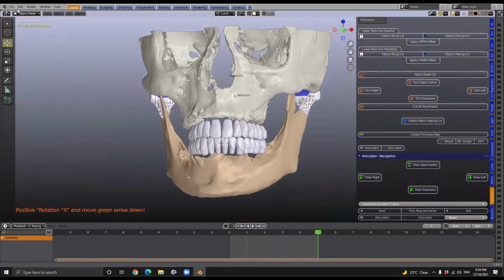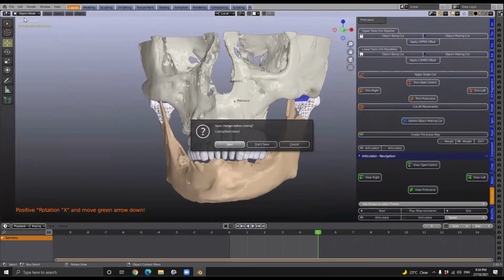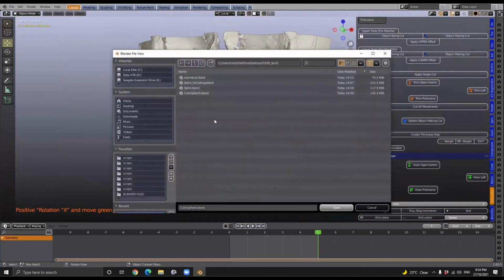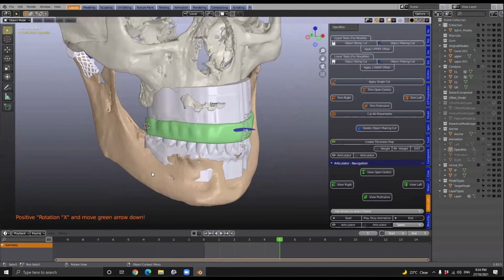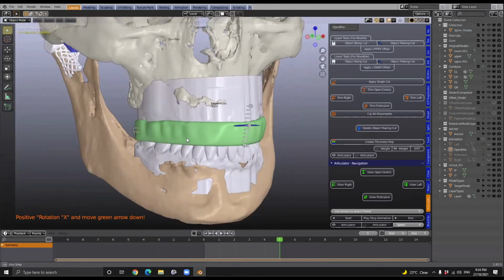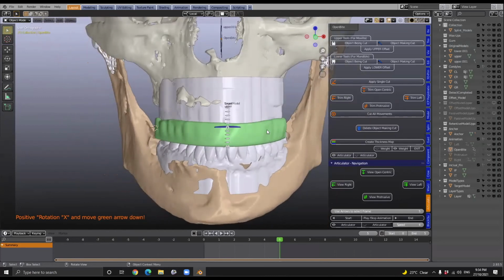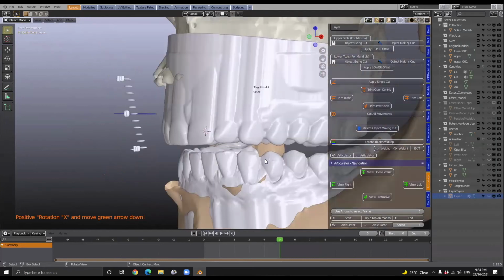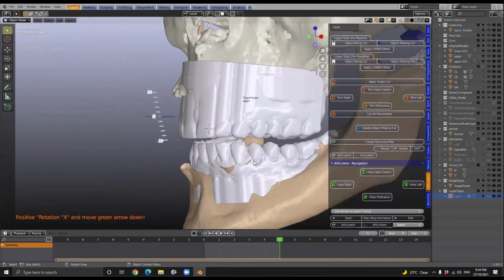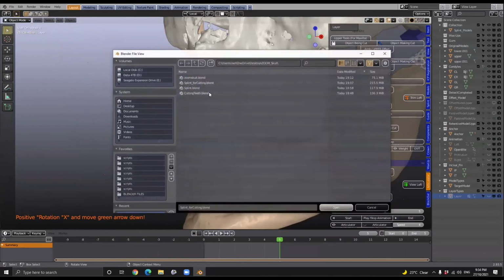All right. So what I'm going to do is bring in a splint. Okay, so yeah, I was just going to ask you about the splint. So, splint for cutting. Now I've made this splint beforehand, and it's got a lot of coverage because it actually doesn't have many undercuts. So here what I've done is, let's just hide the splint, H to hide. What I've done is I've opened the bite. Okay, so this is something I didn't discuss yet. Maybe I should just touch on that quickly.